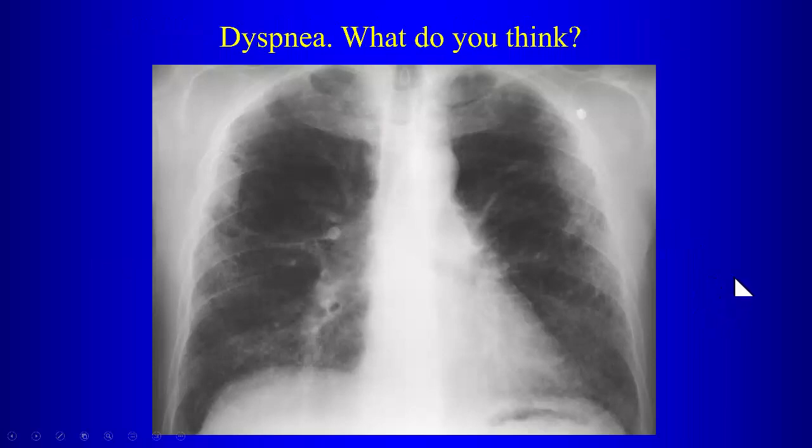Okay? So here's a patient who's short of breath. What do we see on the chest radiograph? Right. So what are you thinking about here? Well, do you have alveolar consolidations or do you have reticular opacities? Well, these are kind of reticular here. Right? These are more reticular. This is scapula here. Right? These are reticular opacities in the periphery. Yeah, so these are interstitial opacities.